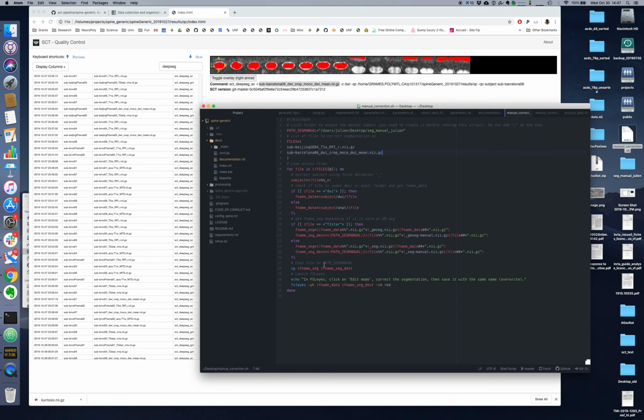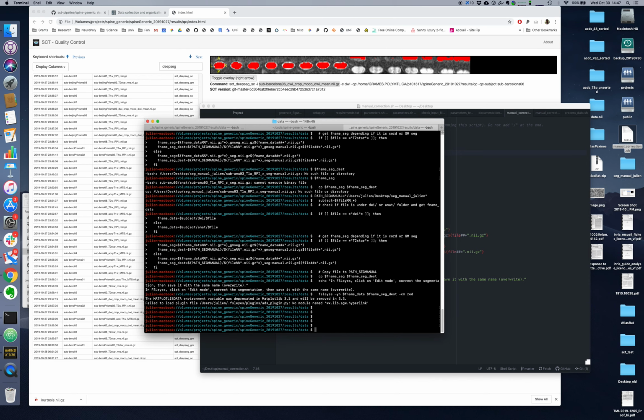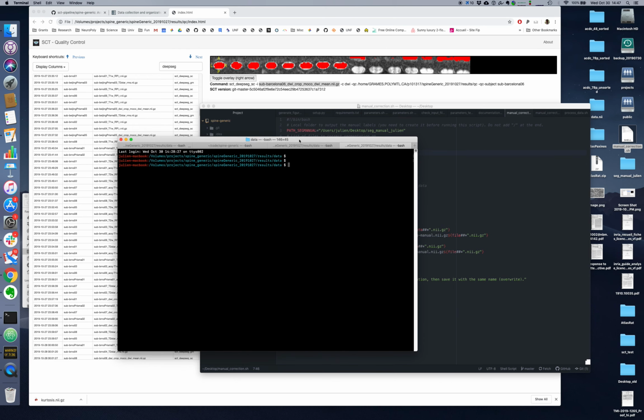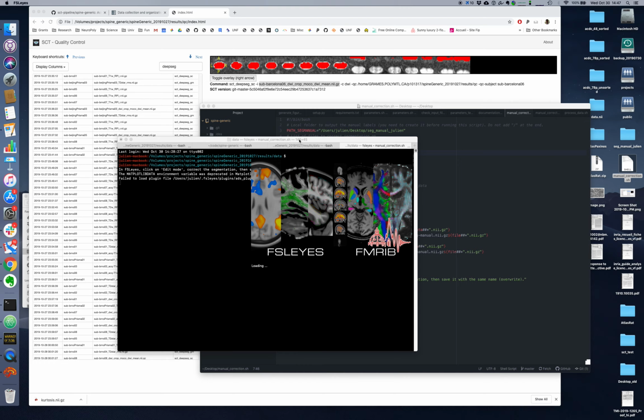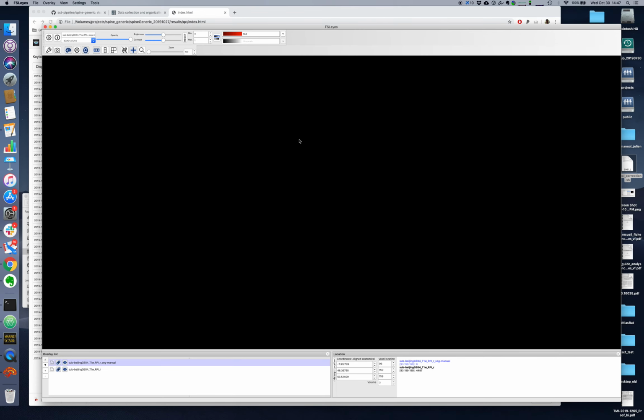Okay, so you can open a terminal window, and then I'm going to run this script. So I'm calling it sh, and then it's under desktop, and then the script is called manual correction. Enter. So it will loop through the first subject, which is this one.